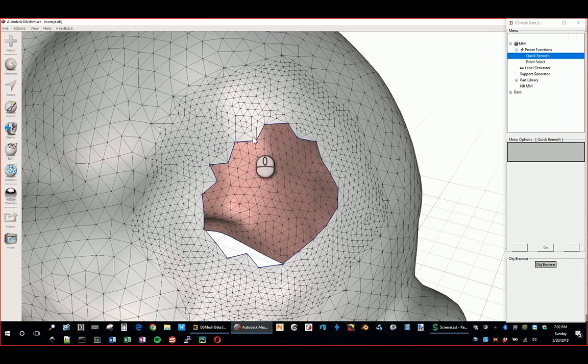Essentially what it did is it took that one ring of triangles, expanded it 2 or 3 times a little bit further out, and remeshed it in an adaptive form, just to make it a little bit higher density, as well as an improved triangle mesh in that specific region. It transitions better from the further side of the hole to the nearer side of the hole where the boundary is.